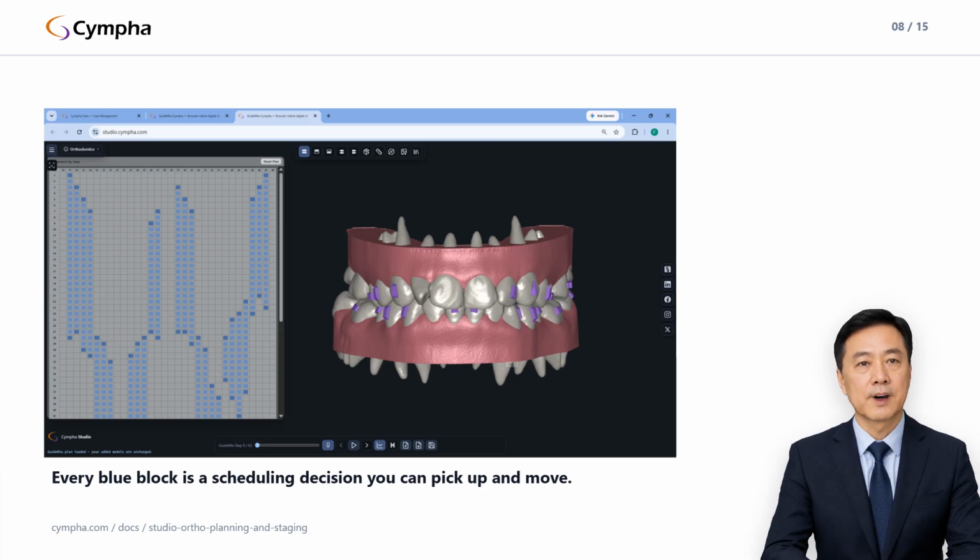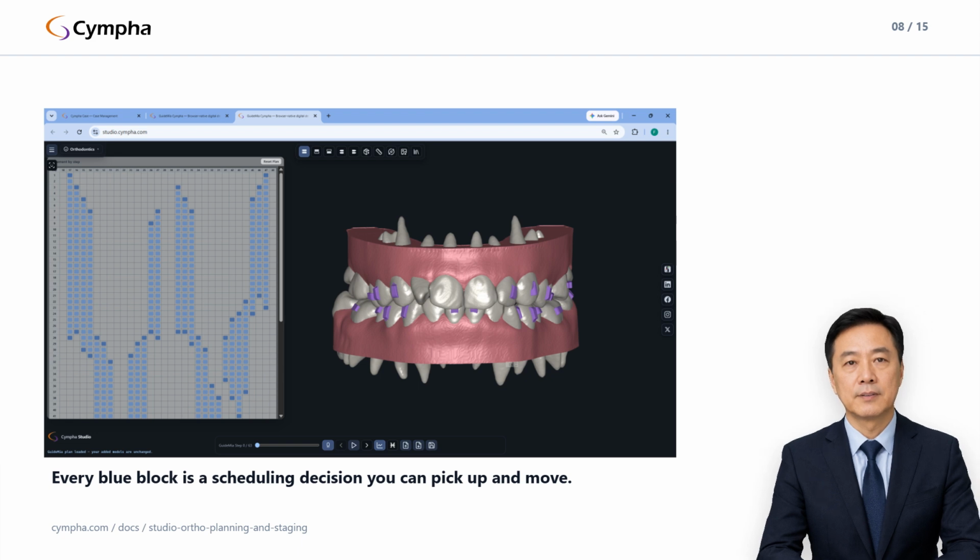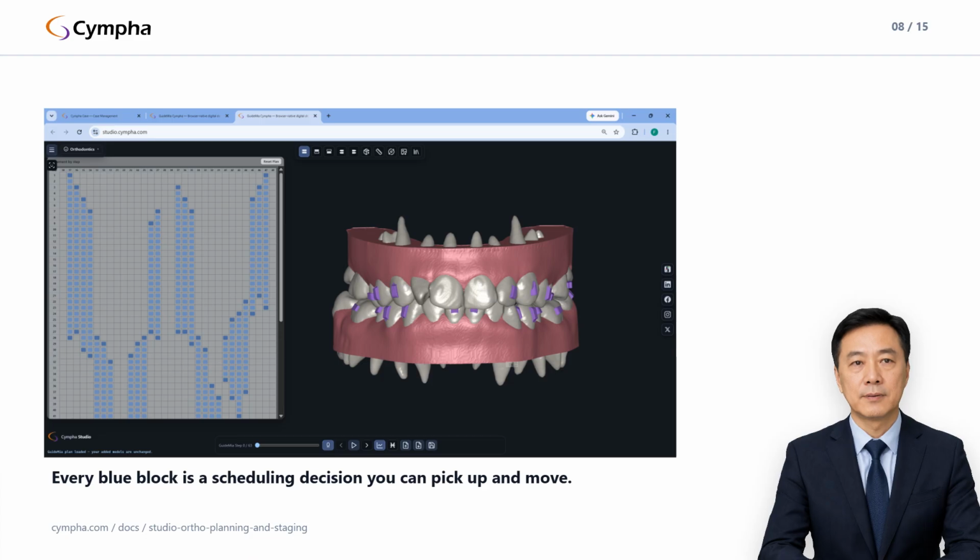If you want to jump the viewer without picking a tooth, double-click the row header, the step number. Instead, the viewer moves to that step and the column selection clears. Two gestures, two intents. Cell means step plus tooth, header means step only.